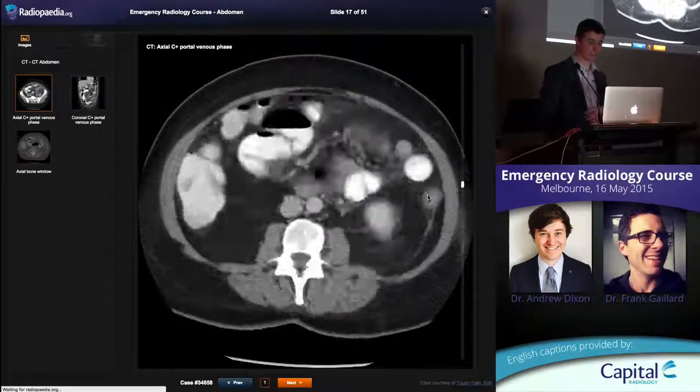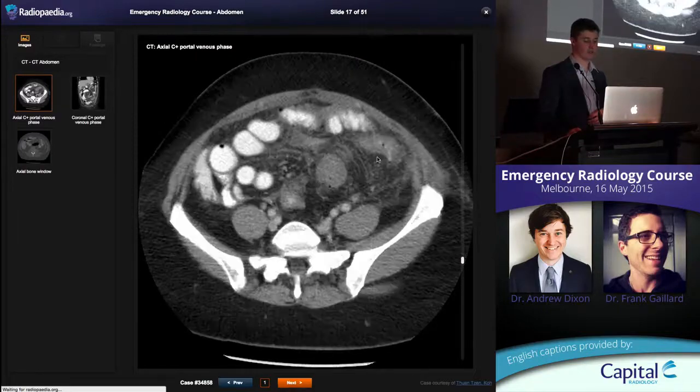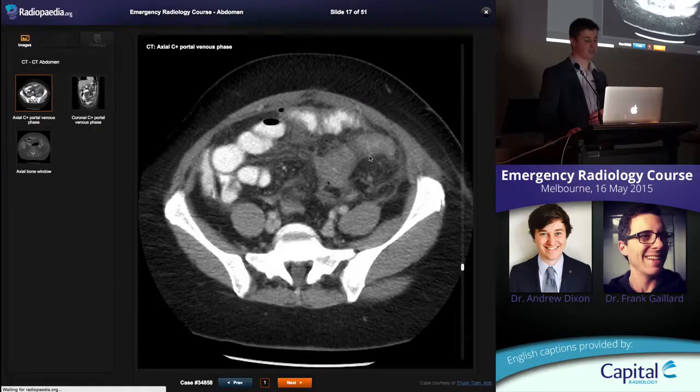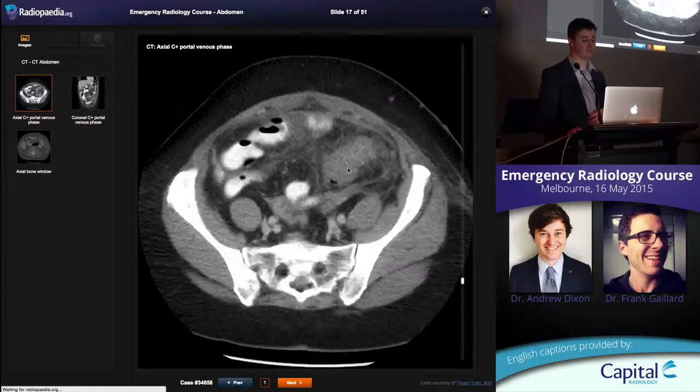Okay, and we're moving on to diverticulitis. Again, we're looking at the same kind of thing. Bowel loop, the wall's too thick. Look how thin the wall is over on these other bowel loops. You've got some reactive thickening of small bowel loops next to it, stranding in the mesenteric pericolic fat. Really, really thick segment, quite a long segment of sigmoid, which is thickened.